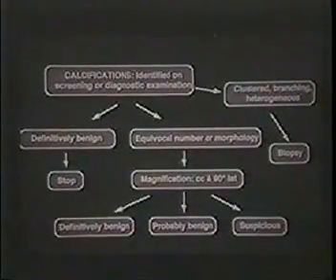We wouldn't do any workup, but we would do routine follow-up on that woman in terms of screening. By definitely benign, we'd be thinking of the kinds of calcifications we saw earlier. Skin calcifications, we proved were in the skin. Milk of calcium, none of those would need to have any intervention.